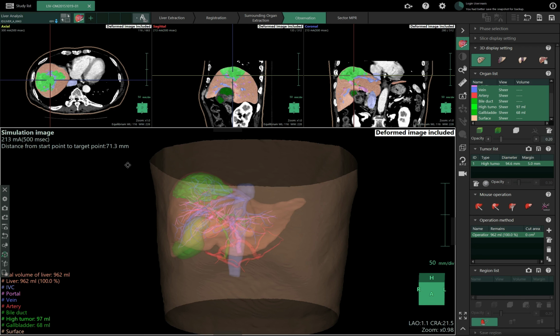I have made the demonstrations for them, and they say that they are not completely sure that this extraction I am showing is 100% accurate, 100% precise, because they have found out that even the image can cheat on you and not be really what is inside the patient, because their own radiologist has failed in some cases.